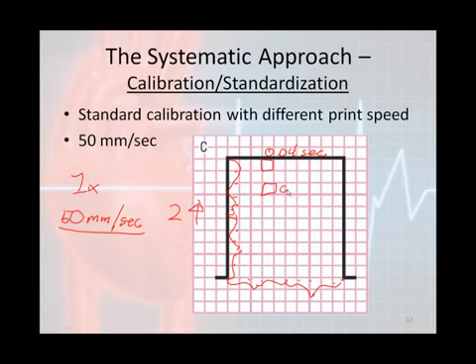It is now actually 0.02 second, because it prints much quicker. So this would throw off all of our intervals, so we can no longer say that 3 little boxes is 0.12. If we want to look at 0.12, we now have to look at 6 little boxes.